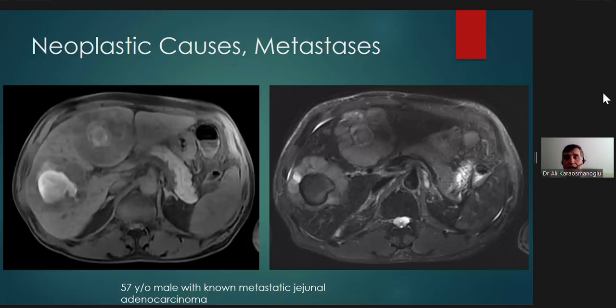So another patient, this is an adult patient, a 57-year-old male with known jejunal adenocarcinoma, known metastatic liver disease, undergoing chemotherapy, presented to ED, again, same clinical scenario, diffuse abdominal pain, mostly in the right upper quadrant, so immediately underwent ultrasound and MRI examination.